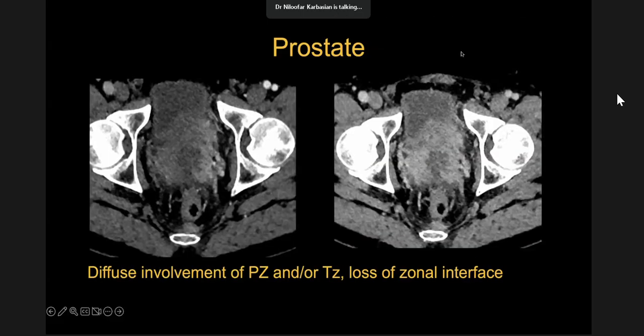This is an example of IgG4 disease involving the prostate, similar to the way that lymphoma can involve the prostate. This is an outside-in disease, meaning in contrast to prostate cancer, which usually starts within the parenchyma and goes out, this usually starts in the surrounding prostate tissue and then involves the prostate and bladder from the periphery.